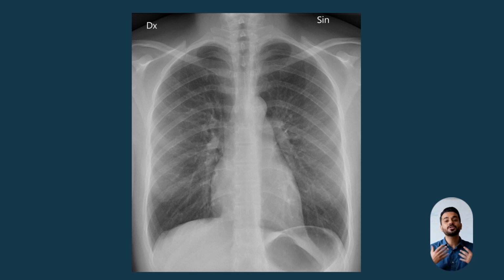Here is a chest x-ray from the back, aka a PA view. It looks simple, but it is not. What you are looking at is a two-dimensional image of a three-dimensional space. The heart, the lungs, the ribs, the spine, the blood vessels, everything is here, but it is all layered on top of each other in one flat picture.